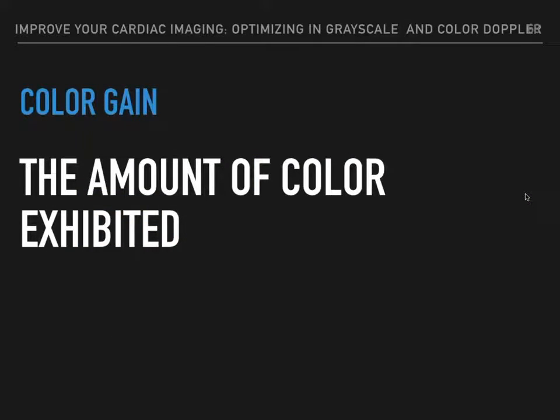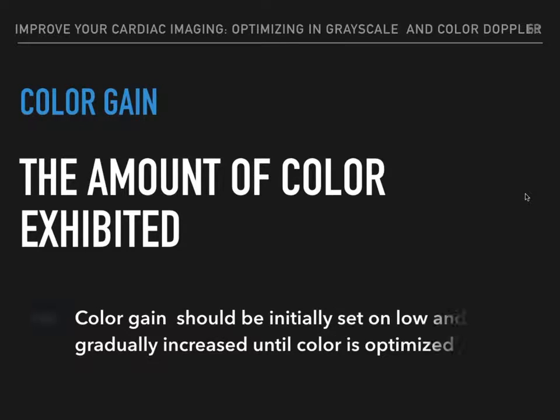Color gain, the amount of color exhibited. So color gain should be initially set on low and gradually increased until color is optimized.